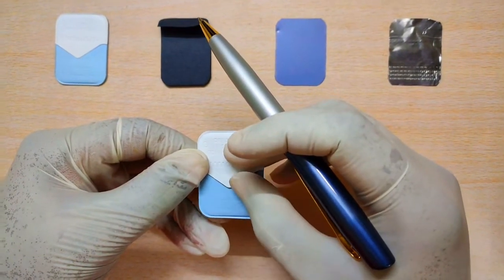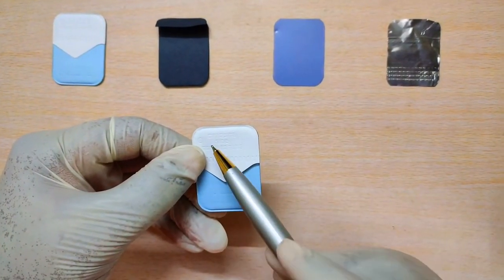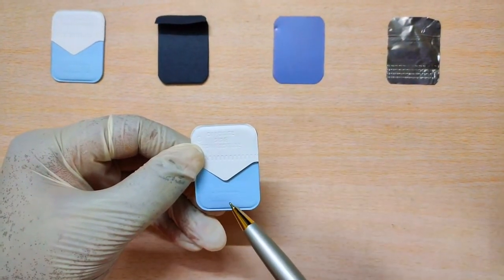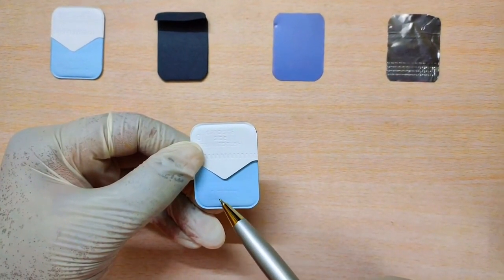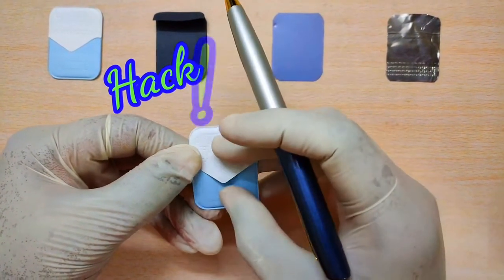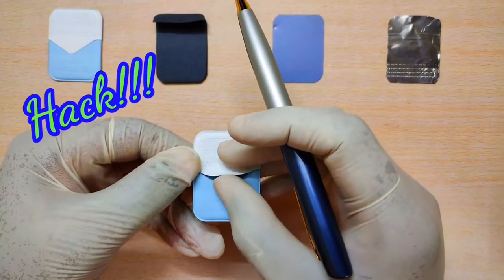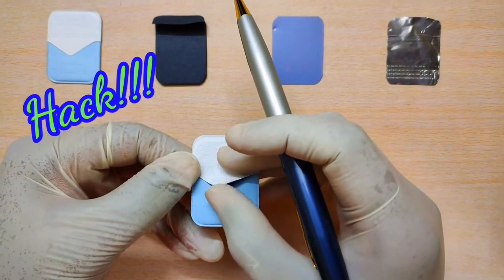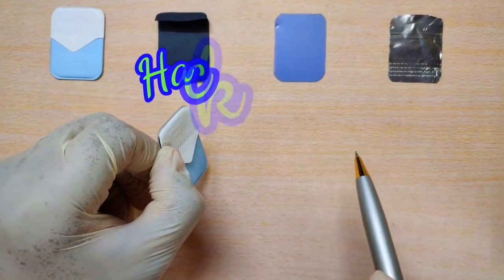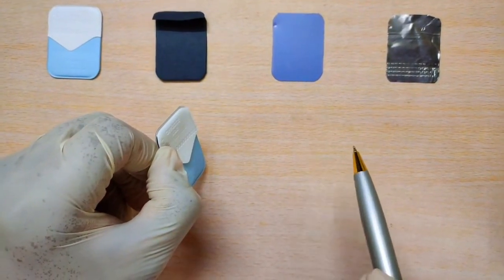It has labelings like speed of the film and a note saying opposite side to tube. E or F speed film is used over here as it is superior from the diagnostic point of view. And here is a hack for you people. So can you see this tongue-like flap on the label side? Make sure that this is always facing the tongue of the patient. By doing this, you may not go wrong with the placement of the film while making a radiograph.